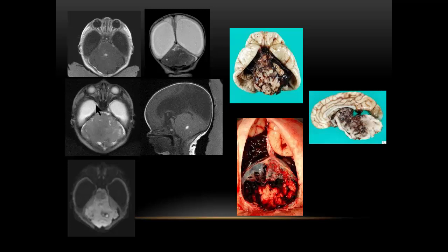Baby was delivered and then scanned, and you could see the teratoma again, areas of hemorrhage, and a lot of hydrocephalus. Unfortunately, baby died, and you can see even on the pathology pictures part of the cerebellum being normal, but a large tumor developing in the posterior fossa. So this was really helpful for management.